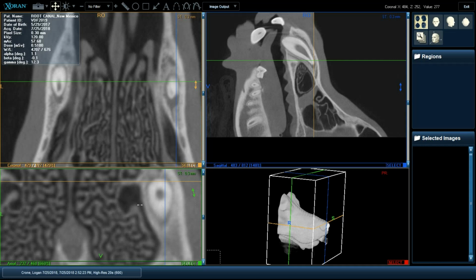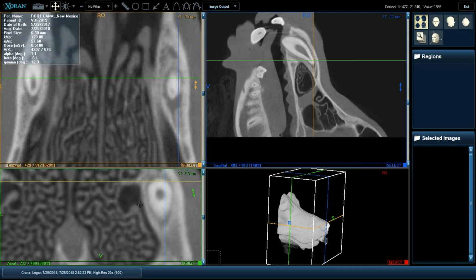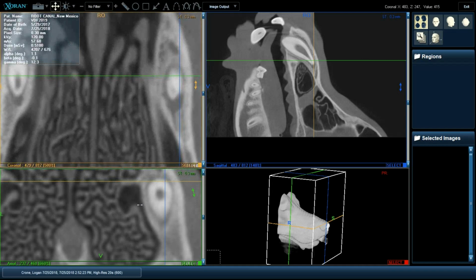And we can now see very, very well that there is increasing space and the beginning of a leakage and the periapical lesion developing on the right side. All of that is very obvious on the CT scan, and sometimes a bit surprising how easy it is to see because it's so large. And you can see it here pretty well.